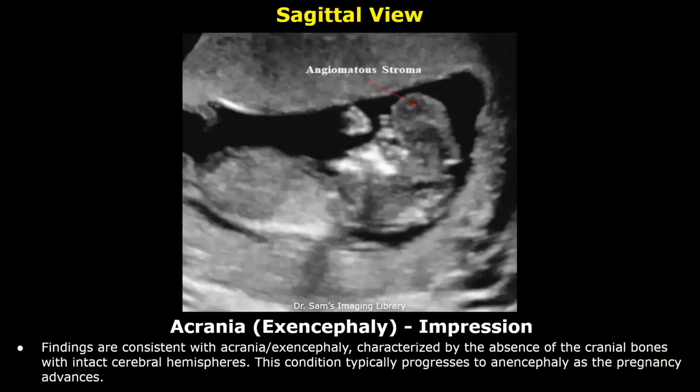This is the impression. Findings are consistent with Acrania or Exencephaly, characterized by the absence of the cranial bones with intact cerebral hemispheres. This condition typically progresses to anencephaly as the pregnancy advances.